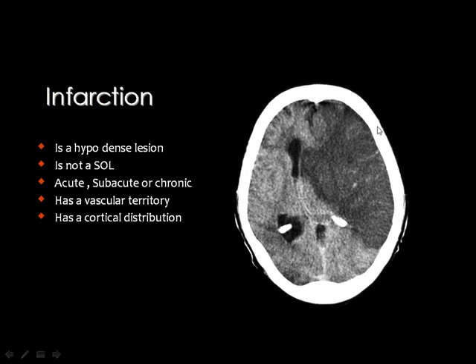Then we came to the infarction, and the infarction is dead brain tissue secondary to cutting of the blood supply. Then you will see an area which is dead in the brain.